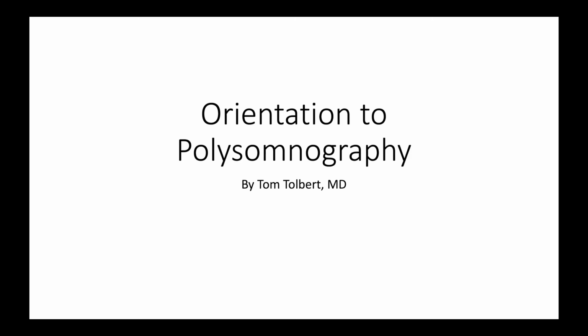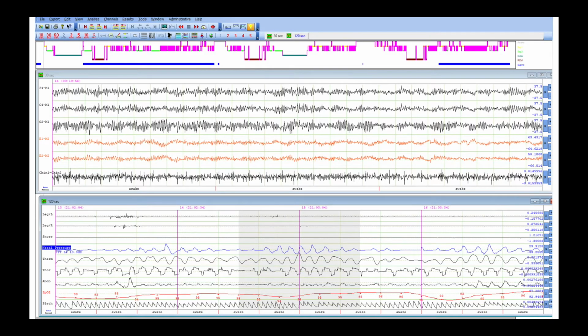I work in the sleep medicine department at Mount Sinai, and this is an orientation to polysomnography, to PSG, for people who are just starting to learn how to read sleep studies. In our lab, we use two programs to read sleep studies, either Compumedics or Minerva, and the examples I'm going to be giving here are through Minerva, but right here is a fairly standard display of an interface you might see in order to read a sleep study, and it is intimidating. There is a lot of information here, a lot of signals, a lot of stuff that's hard to understand the first time you look at this.